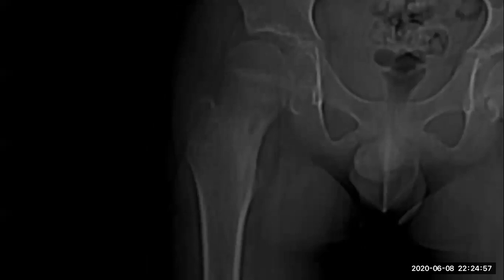That sclerosis is surrounding what? Why is there sclerosis? Is it pathological or is it reactive? It's reactive. There is a nidus with vessels, and there is a reactionary sclerosis. What is your differential? Osteoid osteoma. Osteoid osteoma, or other differential? Osteoblastoma, but it's more than 2 centimeters.